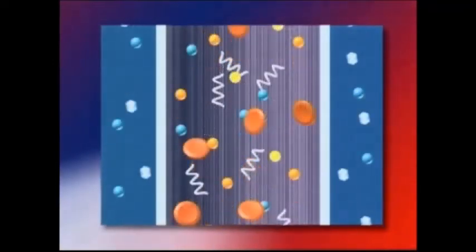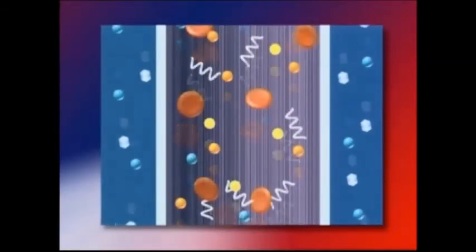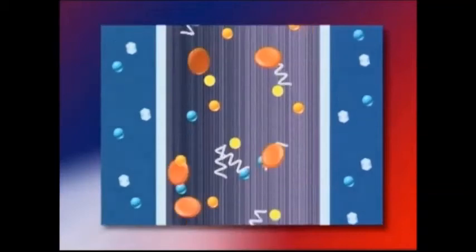Blood is full of tiny particles like cells, proteins, vitamins and so on. When someone has kidney failure, there are also toxins in the blood that would normally be removed by healthy kidneys. These wastes pass through the semi-permeable membrane into the dialysis fluid and are removed. By increasing the pressure on the membrane, excess water can also be removed from the blood through the dialyzer. Larger particles needed by the body, like proteins and cells, remain in the blood.